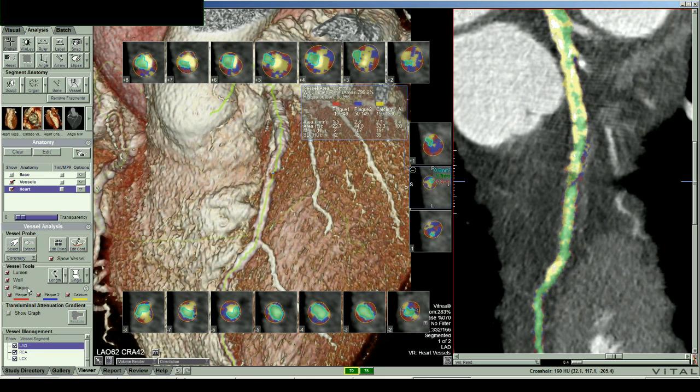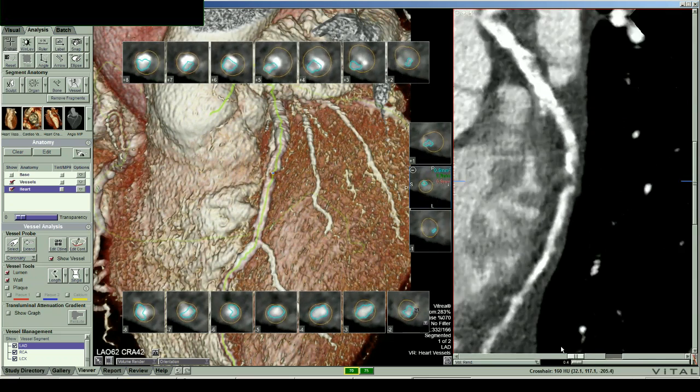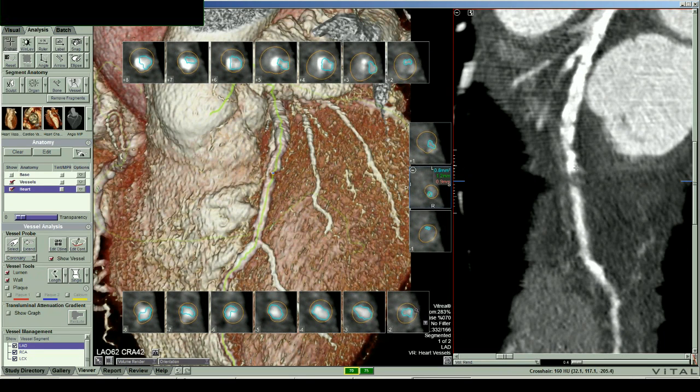And so if we take off this thing showing the lumen, there is no continuity of contrast spanning across here where it used to be. It's totally occluded. Right there you can see contrast ends. Contrast begins again, so that means that this is retrograde filling.